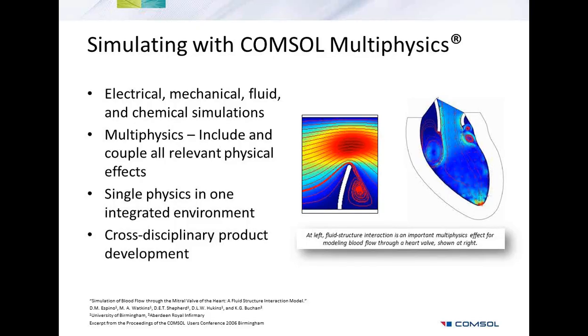We'll take a look now at simulation in the COMSOL environment. COMSOL is a multiphysics as well as a single physics simulation platform, and it covers mechanical, fluid, electrical, and chemical simulations, or really any physics that you can think of. COMSOL is particularly well known for multiphysics or coupled phenomena. By this we mean two or more physical effects that interact with each other, without limitation to the number of physics that can be included in a model.